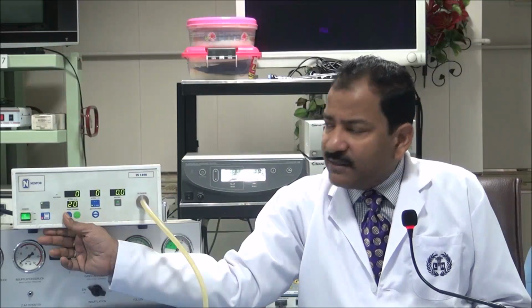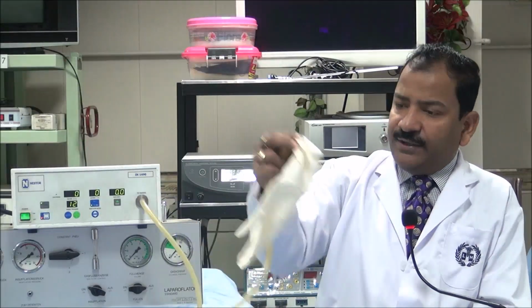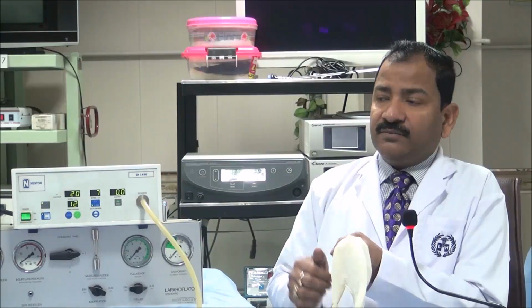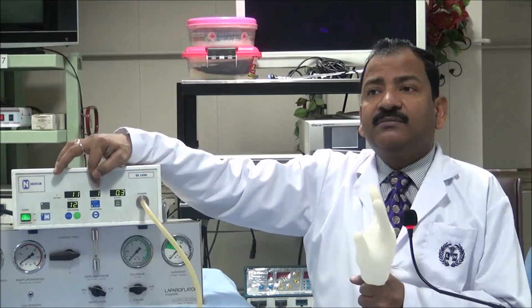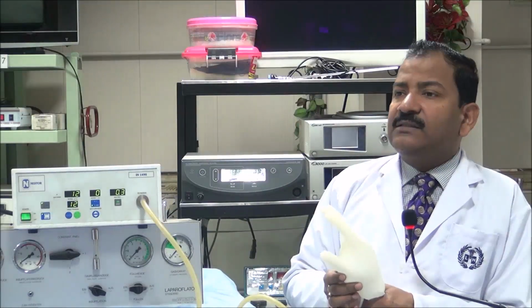So this is preset pressure. What is the meaning of preset pressure? Preset pressure is a command given by the surgeon to the insufflator to keep the pressure at that level. Suppose this is the abdominal cavity, and I start the flow. It is increasing: 8, 9, 10, 12. Now 12 came, then the flow becomes 0, because now the desired pressure is achieved.